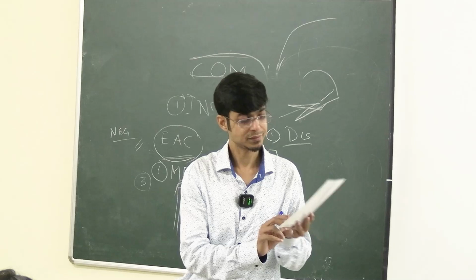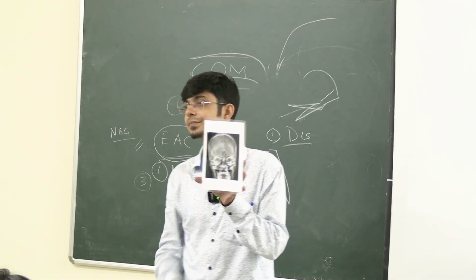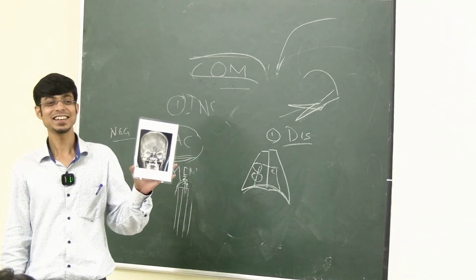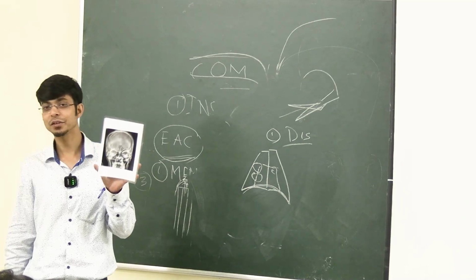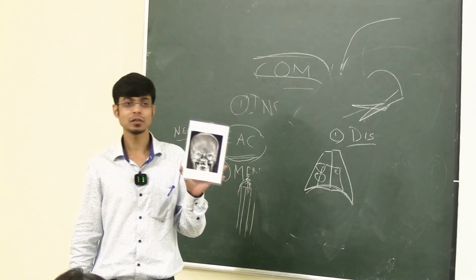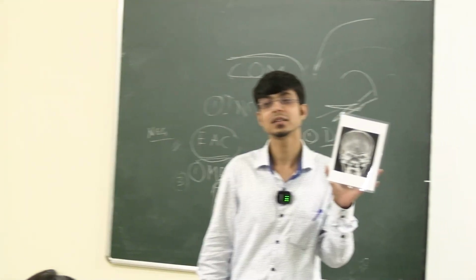And what is this? There is nothing called occipitofrontal view. It's a... Who can tell? Okay, very close, AP view. Okay, this particular name for this view, have you gone through this? Has anyone read it?